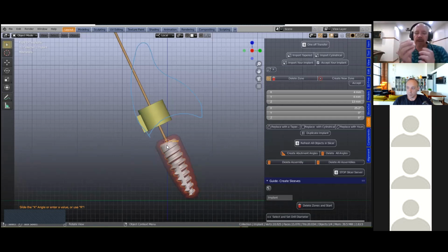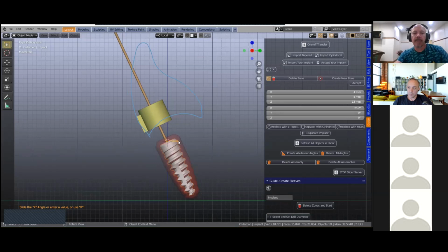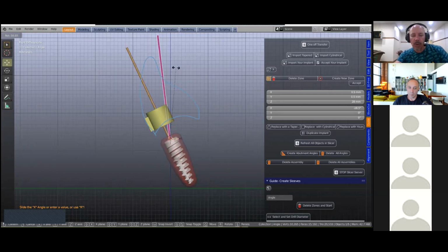So you can look on the implant and match the location with the buccal notch, and then as you're turning it down, that specific face or the hex then faces that notch when you tap this implant in, and then once we click on create angles, we can rotate this accordingly.